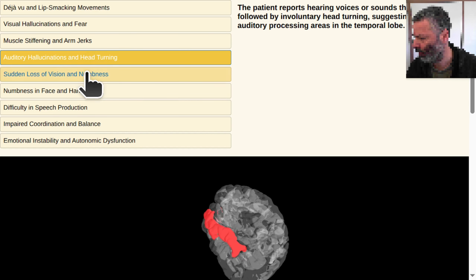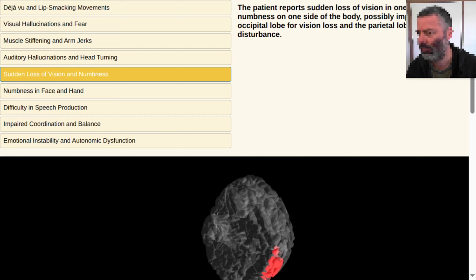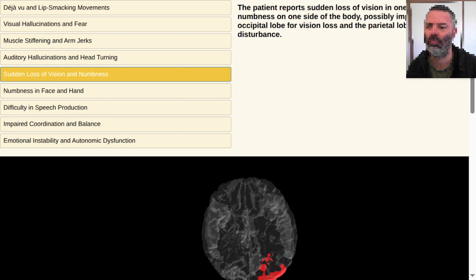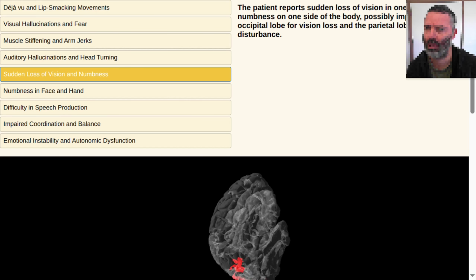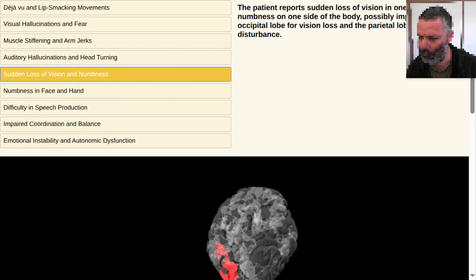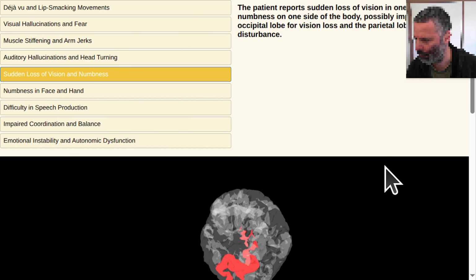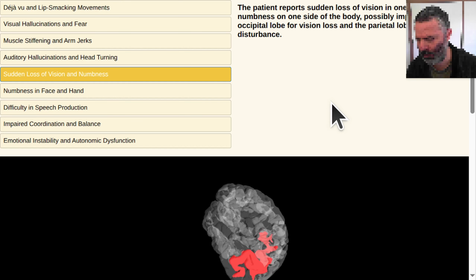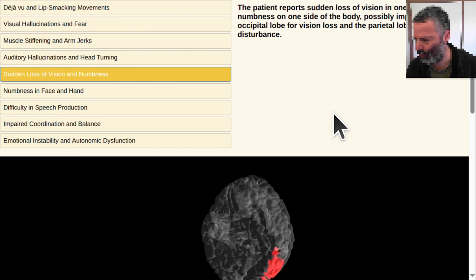You can see the raw EEG, but the spectrogram makes the patterns jump out. It's using time-frequency analysis to make the invisible, rhythmic electrical patterns of epilepsy immediately clear. It showcases the real-world application of your tools, taking complex signal processing and applying it to a critical clinical need. This is where the chaos gets controlled. Go explore the critical analysis environment.